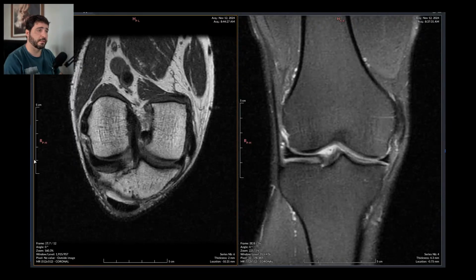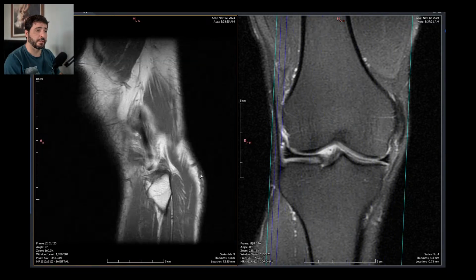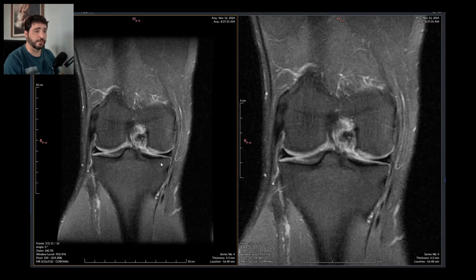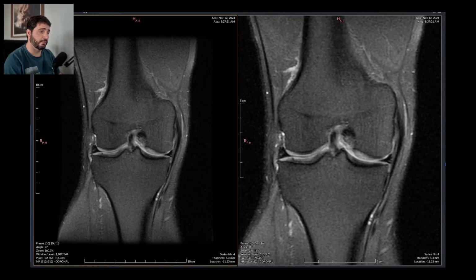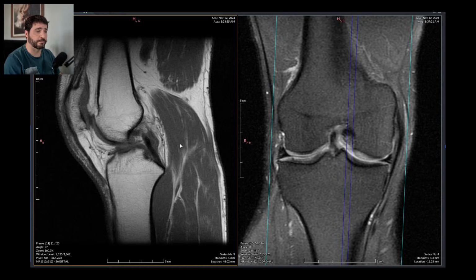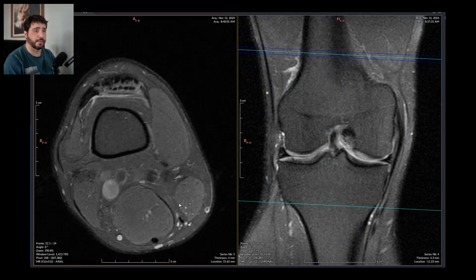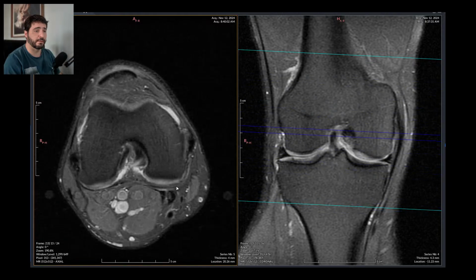And by looking at it, I can say it's mild. Another doctor could classify it as moderate, or I'd rather say it's mild, especially because the rest of the knee seems fine. And we don't have a proper scan. We just have this poorly done scan right there.